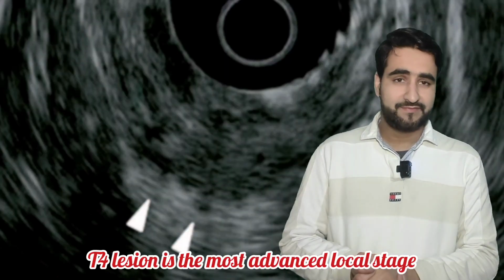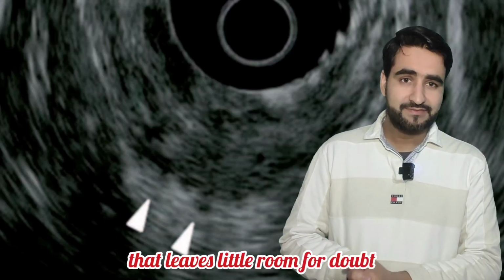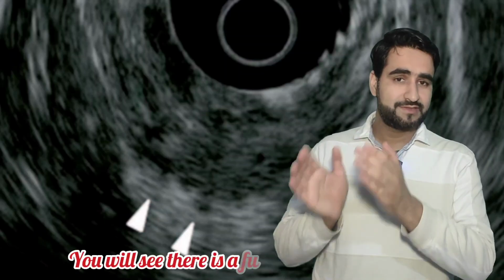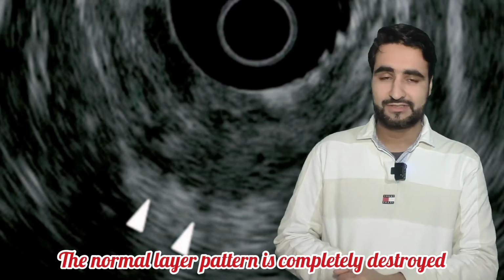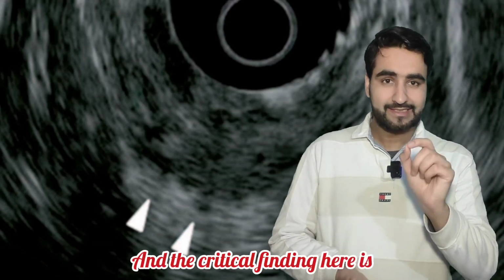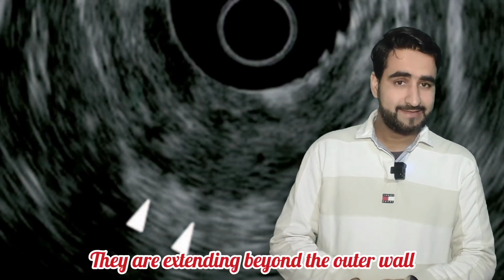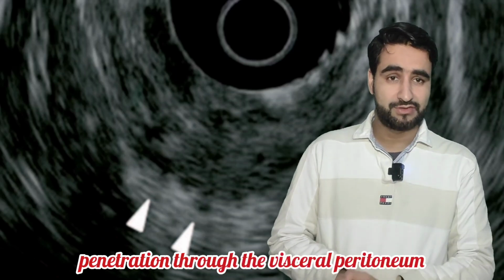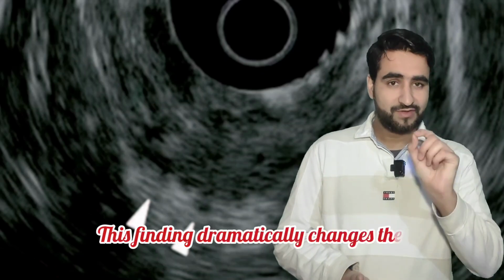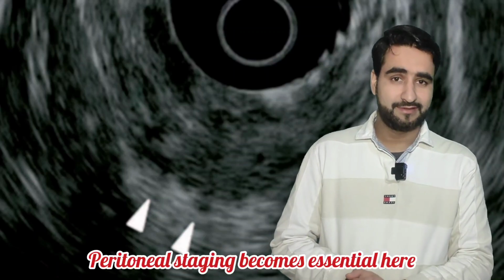A T4 lesion is the most advanced local stage, and endoscopic ultrasound gives a striking image that leaves little room for doubt. You will see a full thickness thickening of all 5 gastric wall layers. The normal layered pattern is completely destroyed from mucosa to serosa. And the critical finding here is serrated or spiculated projections. They are extending beyond the outer wall. The irregular outer margin represents tumor penetration through the visceral peritoneum. This finding dramatically changes the treatment conversation. Peritoneal staging becomes essential here.